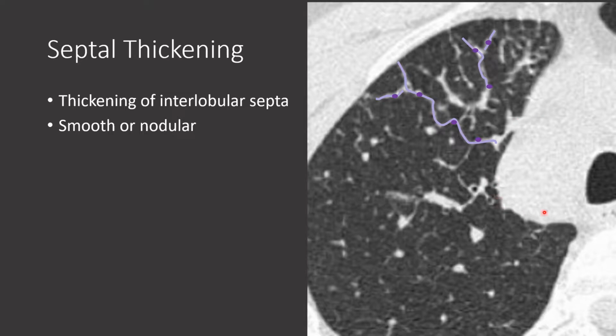Also notice the enlargement within the mediastinum in here. This represents lymph node metastasis.